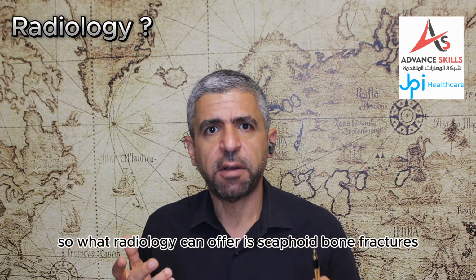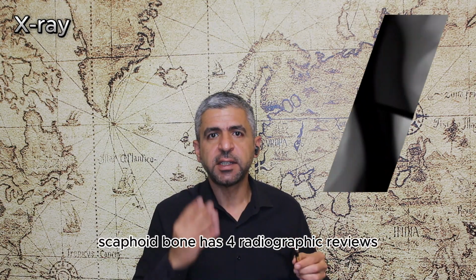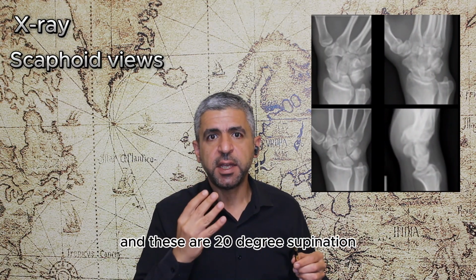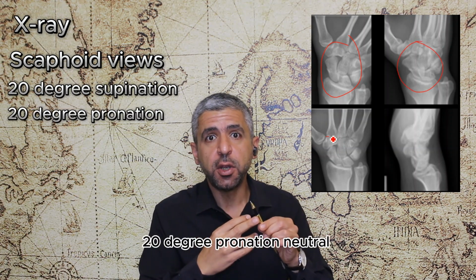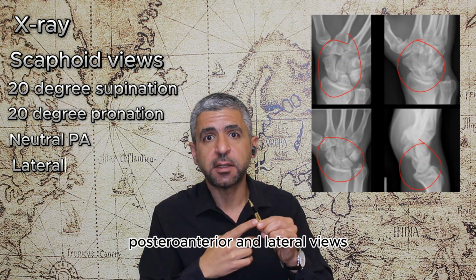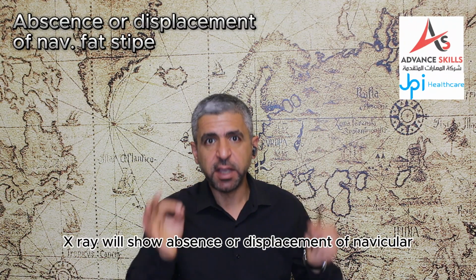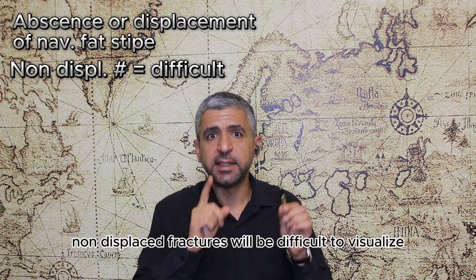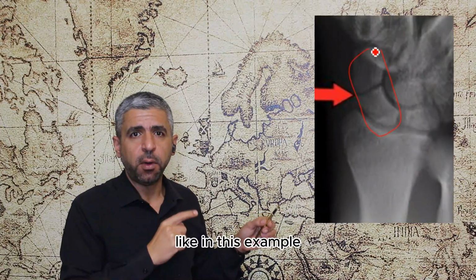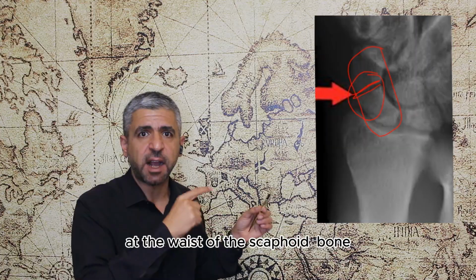So what can radiology offer in scaphoid bone fractures? Regarding plain radiography, scaphoid bone has 4 radiographic views, and these are 20-degree supination, 20-degree pronation, neutral posterior-anterior, and lateral views. Plain X-ray will show absence or displacement of navicular fat stripe. Non-displaced fractures will be difficult to visualize on X-ray. Like in this example, we can clearly see the non-displaced fracture line at the waist of the scaphoid bone.